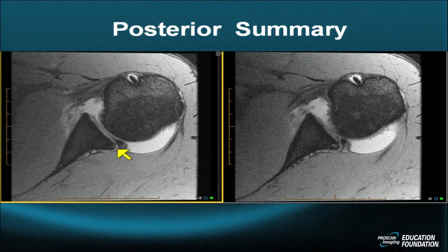We'll assess the underlying bone itself. In this case, there's some irregularity. There's also some loss of its overall contour. In other words, it slopes backwards and doesn't quite hug the humeral head in its cup, and a small pseudocyst is evolving. We'll assess the relationship of the periosteum to the underlying glenoid, which is also affected. We'll also want to assess whether there's a piece of bone that's involved in this process.